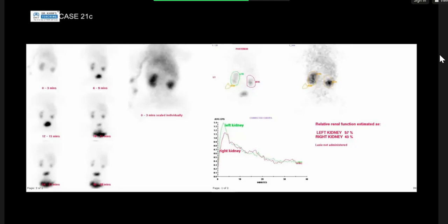Okay, I'm just going to go through the interpretation of the MAG3 because I think you've got things a little bit confused. So this is looking at the uptake of the kidneys and then the excretion into the bladder over time. And then this is your static image representation of that. And then this is your graph that shows how they uptake and excrete. What I wanted you to point out is that you can see that there's uptake of the isotope in the left kidney, and then in the right kidney, there is uptake in the lower moiety, but in the upper moiety, you're not getting much uptake.